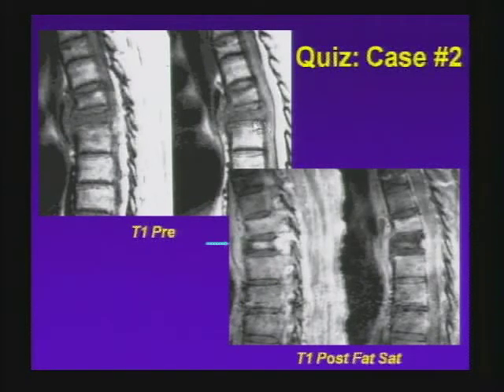Of course, you have a compression fracture, and 100% of the marrow of the compression has converted from fatty marrow to abnormal. And that's unusual in osteoporosis. Usually with osteoporosis, there's a little normal marrow left somewhere. There's some compression fractures, but there's no other vertebra that really looks this bad. With gadolinium, there's tremendous enhancement of the anterior longitudinal ligament quite far away from the actual lesion, not to mention all of this epidural enhancement here. So there's something clearly intensely inflammatory here.